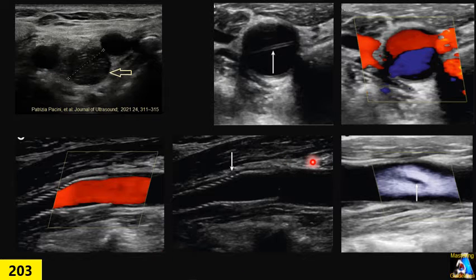Another one is sometimes post-surgery, repaired with endarterectomy, and they put in a stent. We can see a stent, usually metallic, and the linear pattern of the border wall of the stent is very typical and classic. Later we will talk about that in detail.